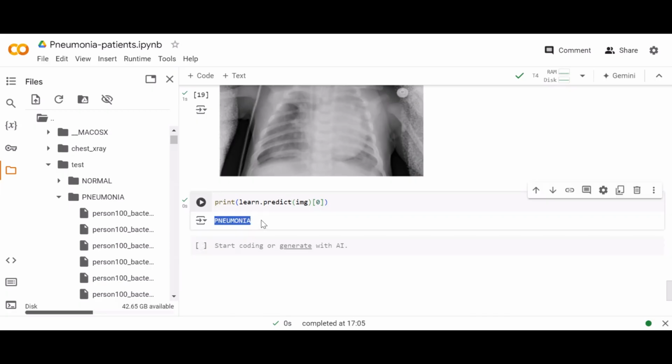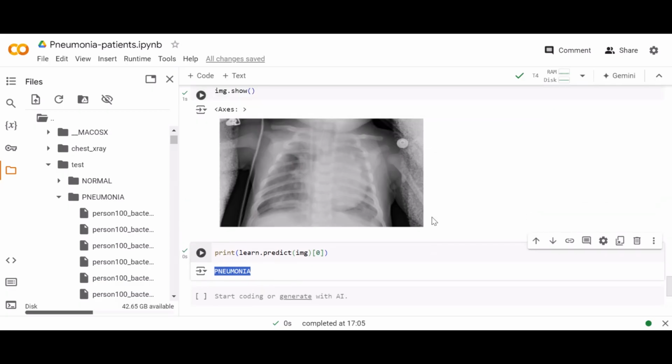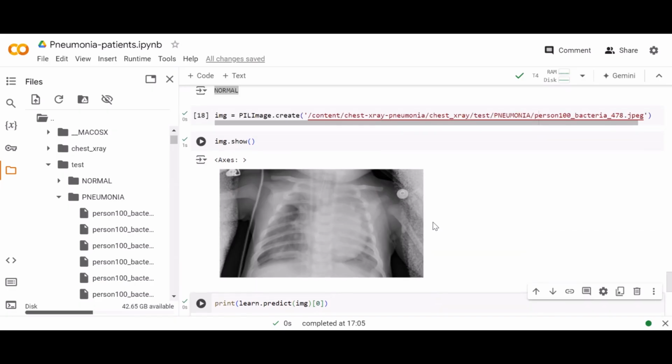So there you go. This was the complete application that I tried to compile for you. Hopefully this was helpful, and this whole application and this whole coding makes sense. You can do the same thing on your local machine, but if you are running it on a CPU, just remember that it will take a whole lot of time and memory from your CPU.